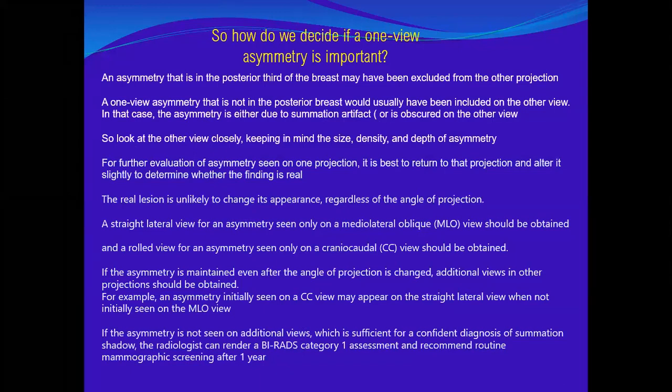For the mass it was clear. This is the mass, obviously, this is the morphology. But regarding asymmetries, we need more examples and examples and examples to make it clearer. Do you agree with me, or is it clear? Yes, I agree with you. It is so difficult. We agree, Doctor. Yes, we agree.